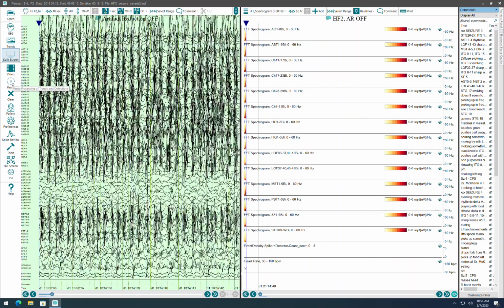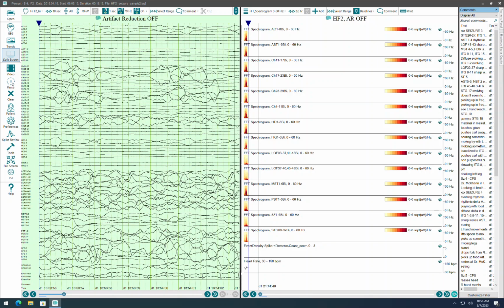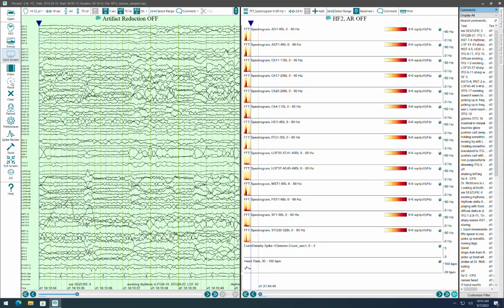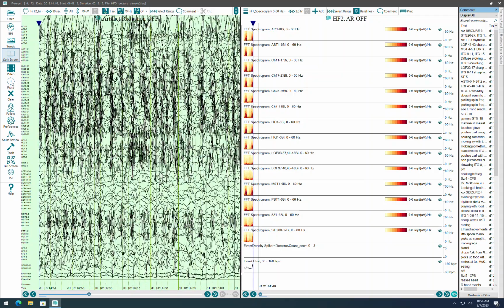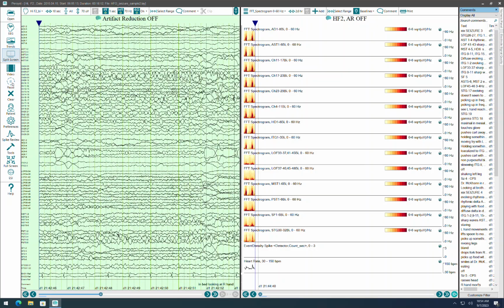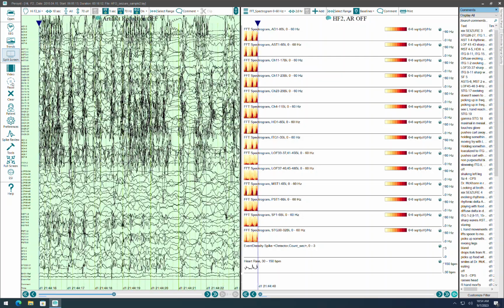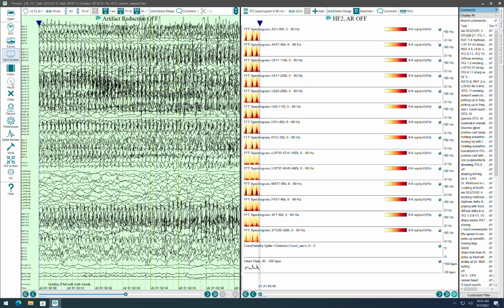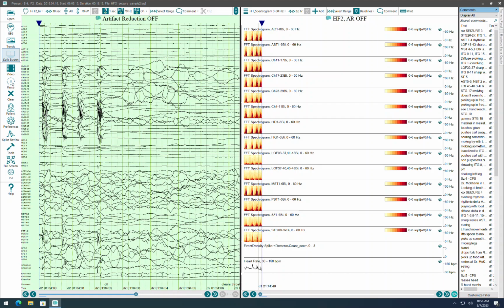And this is not a very long recording, so we'll let it go ahead and complete to the end of this. Now you can configure the spike detection before you begin processing. You can process the spikes after. It does launch a separate application called Reveal, which is the previous generation spike detector. It's no longer used for scalp EEG, but it does allow processing with any number of custom labeled channels. And so that's the option for spike detection in Persyst 14.